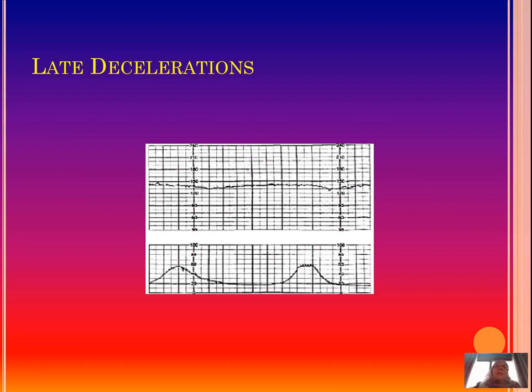This is our late decelerations. You can just see a slight going down of the CTG. Just to put the CTG into context, on the whole this is a very worrying CTG. It not only shows late decelerations, the variability is also reduced, and this is a CTG of quite a compromised baby.